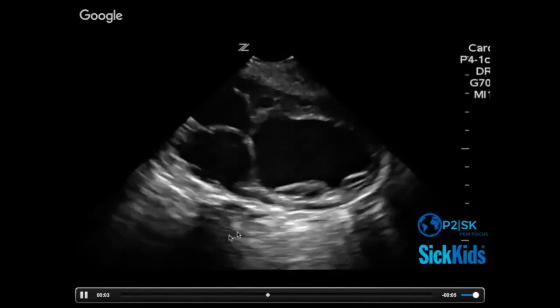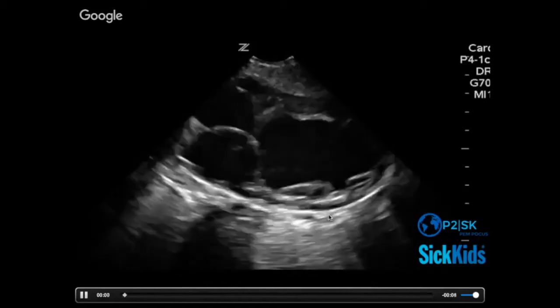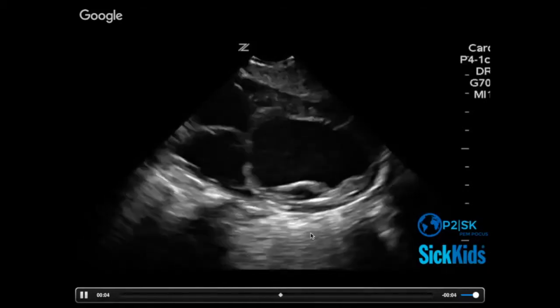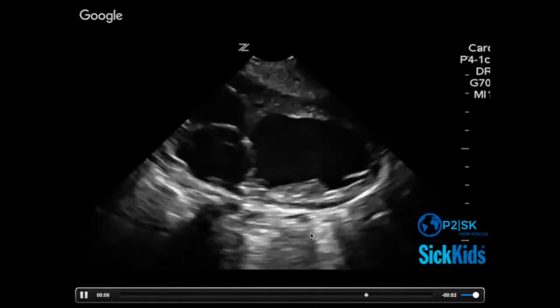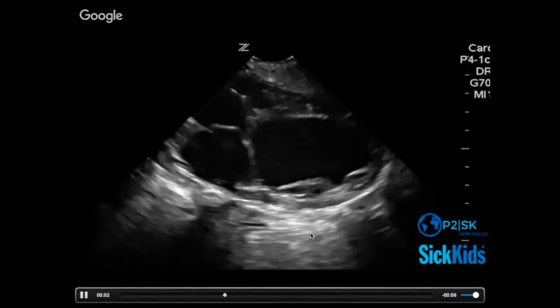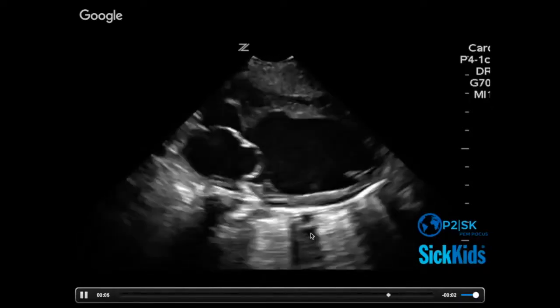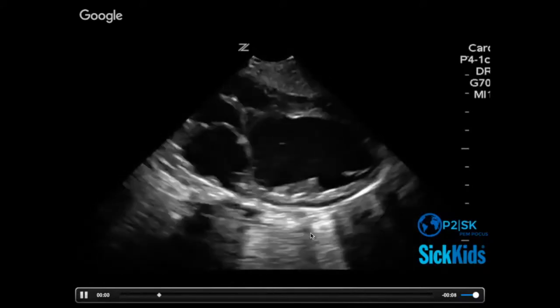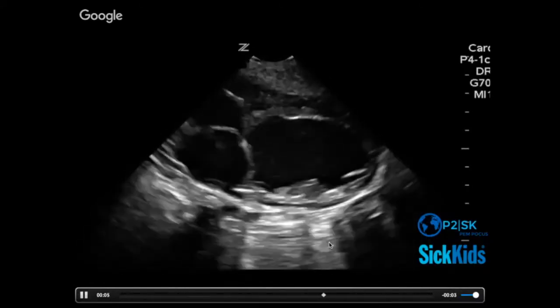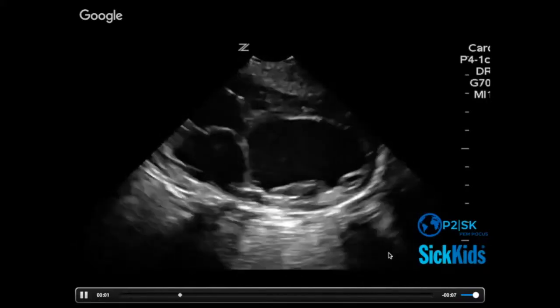Now, people will remark on that. They'll do the cardiac views, and one of the things that jumps out at them is they'll look behind the heart and say, "Oh, look at those B lines." I would caution you that it's something you can see often in healthy people also. And I don't know exactly why the cardiac views tease it out, and then you go to the lung views with a linear probe and you don't see a bunch of B lines. But I kind of shy away from being definitive about, and we're going to have pulmonary edema based on the cardiac shots.